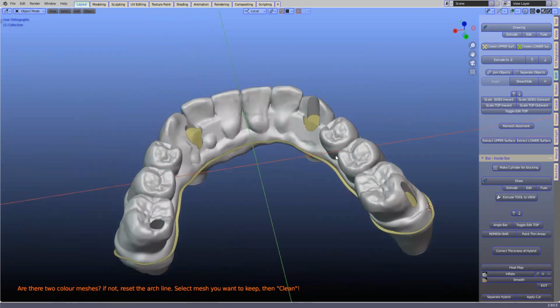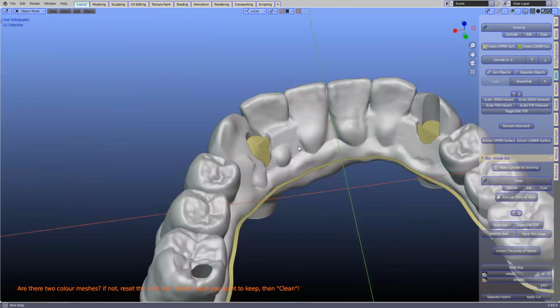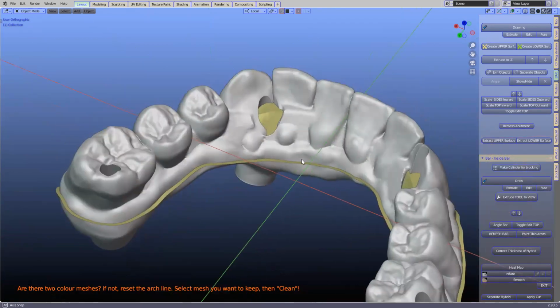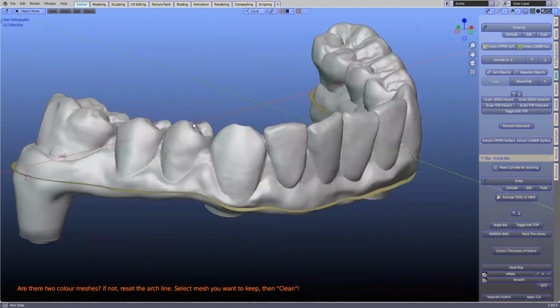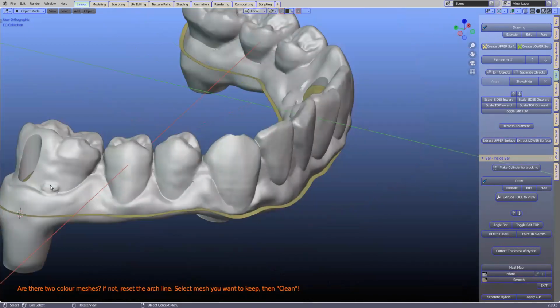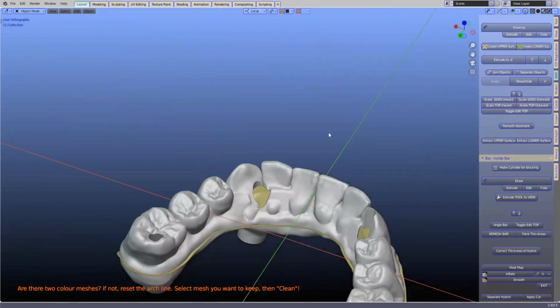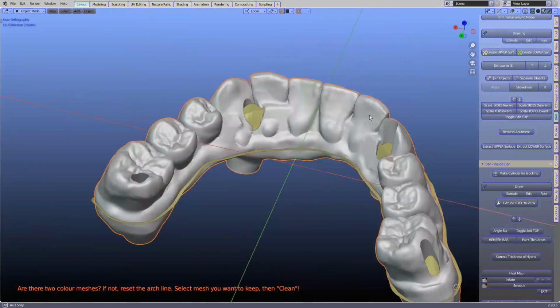So you can actually see here where the bar runs through it. Can you see it? Yeah, I can see it. Of course, that's very important. And here as well, you can see how the bar runs through, and here as well, and here's a little bit there. So those protection cylinders, are they used as a cutting tool as well then?